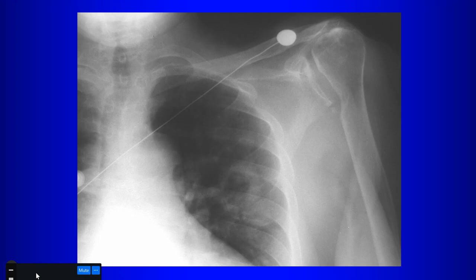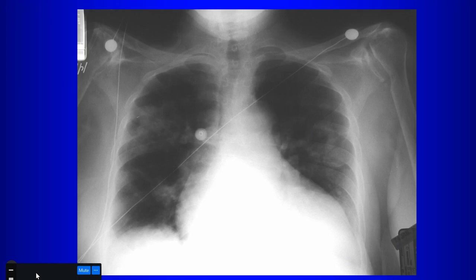Okay, so our differential diagnosis, reaching back into what we've learned, we would suggest what? Septic emboli. Metastases, squamous cell metastases, vasculitis. Well, there's more than one. Infection. Pneumonia is infection. But of course, there's another finding on the x-ray that really helps. The shoulder joints. What about the shoulders? I mean, you're going in the rheumatoid direction. But I want you to go in that direction, so you tell me what the finding is.